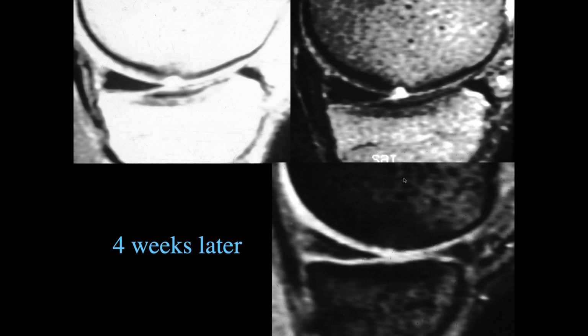Okay, so now we can see some depression of the subchondral bone plate and some overlying full thickness chondral loss. So it looks like an evolving osteochondral lesion. What do you think the prognosis is right here, Jennifer? Well, these are at risk for epiphyseal collapse.